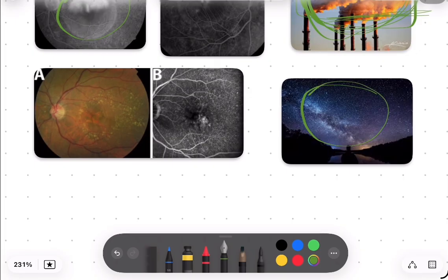Now, if you see this starry sky appearance, okay, which is like over here, you see it, right? Oh, before I go into that, I want to say that drusen are the hallmark for a dry, but then as the disease progresses, you can also see choroidal neovascularization, which is a hallmark. If you see choroidal neovascularization, think of age-related macular degeneration, okay? Because age-related macular degeneration is, of course, age-related, so it's senile, it's macular degeneration, it is chronic, and it's progressive. So not only do you have a bilateral degenerative disorder, but it progresses. So it would start as dry ARMD, where you would have the presence of drusen, but gradually it's going to progress to wet, where you have choroidal neovascularization, along with geographic atrophy.